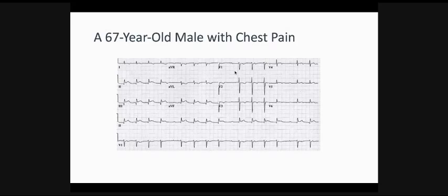one thing that you should keep in mind in the exam is that there are 25 ECGs with the coding, but expect that you will see some of them straightforward and some of them complicated, like the board exam ECGs. But don't panic if you see something that is really straightforward for the exam. That's like a gift for you to pump up your grades. So this should be straightforward for the boards.